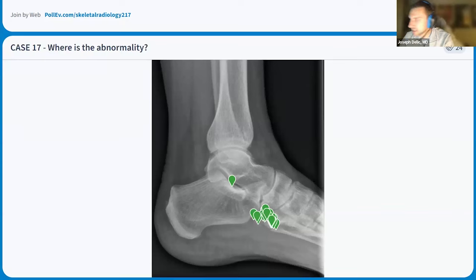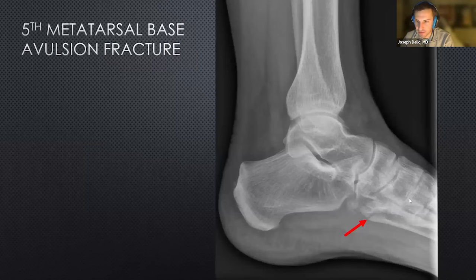So I really like this cluster of markings here at the base of the fifth metatarsal. So this is a non-displaced fifth metatarsal fracture.